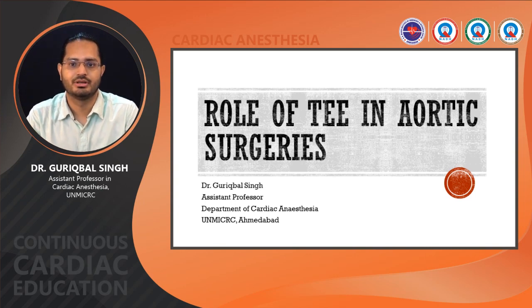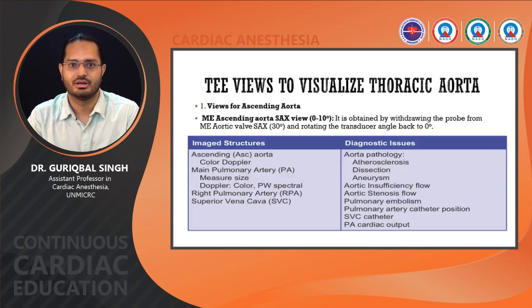Good morning, everyone. Today we are going to discuss the role of TE in aortic surgeries. Coming to the basics, we'll discuss the basic TE views to visualize the thoracic aorta. The views which are used to visualize the ascending aorta are the mid-esophageal ascending aortic short axis view and the mid-esophageal ascending aorta long axis view.